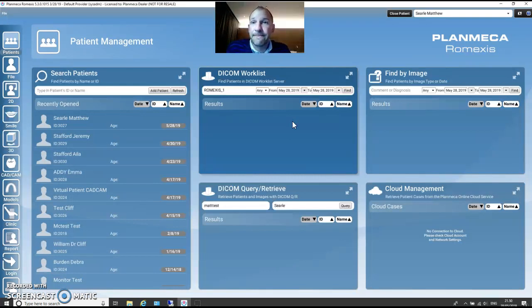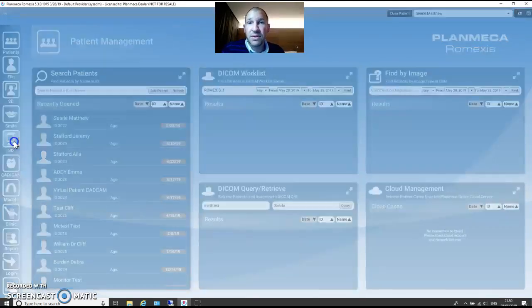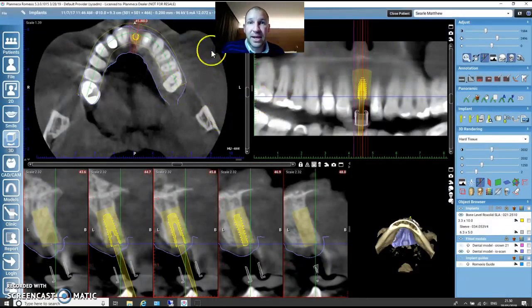So we'll go through everything now, and hopefully I'll squeeze it all in 5 minutes. I'm going to start with the longer things first and then end up in the shorter things. So we'll start off with, I think, one of the coolest workflows, the implant placement and planning.